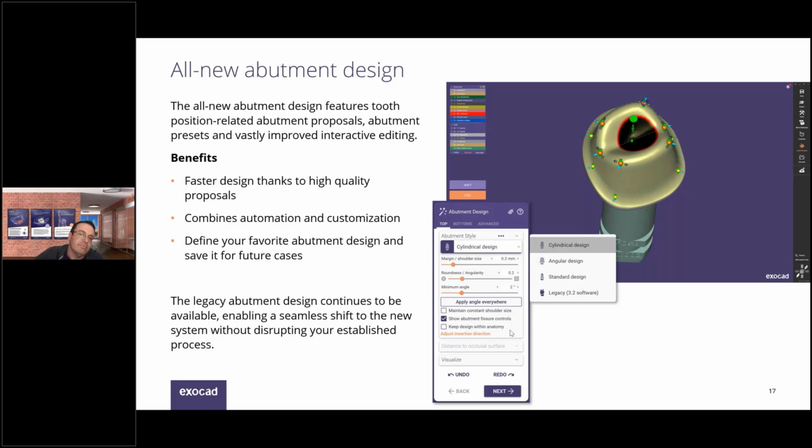If you are still tied to the older design version, the legacy abutment design tools are still in there, so you can change to that selection once you get to that step, if you'd rather continue to work with the previous design step until you get used to the new stuff.